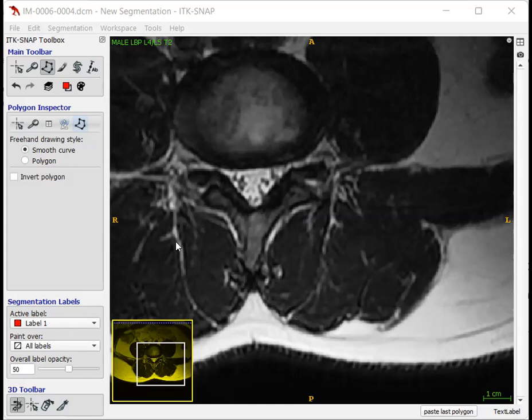It's very clear on the other side all the way down. In this example, we have a little bit at the bottom here and a little bit at the top with a little bit of a discontinuation in the middle, but you can see we're going to follow along that path here and come up to our point. So we're just going to start laying our points down. Again, if you make a mistake and you want to undo the last point, we can click down here. There's lots of time to adjust afterwards.